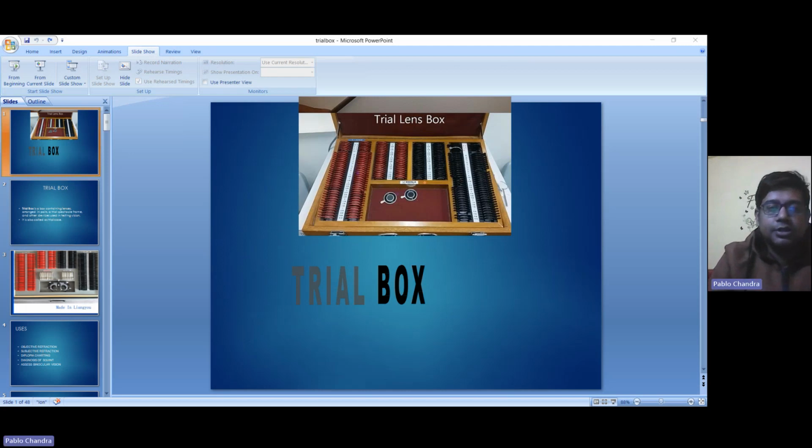So the nose bridge is this one. You can adjust it, and you can put it properly. All this nose bridge adjustment can be done easily with the trial frame. So once you are using this trial frame, you have to set the nose bridge accordingly so that it can be used properly. Also available with fixed bridge or adjustable nose width, for adults with 59 to 67 mm. For children 54 to 58, for adults 59 to 67.